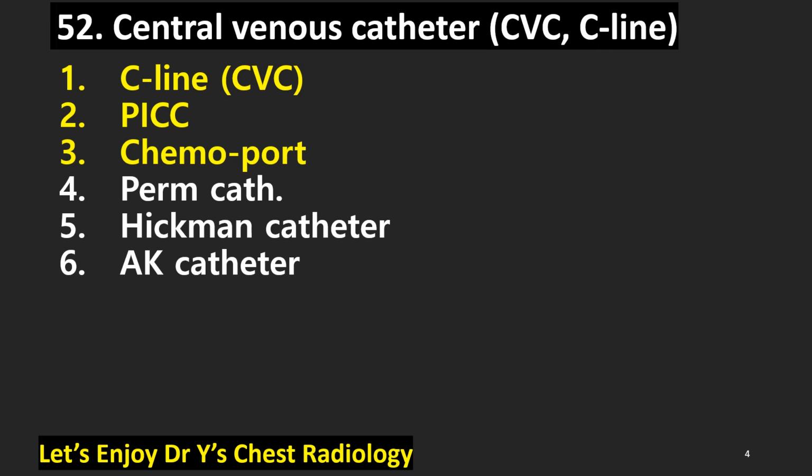Actually, all are central venous catheters. Among them, we have C-line, PICC, chemoport, perm cath, Hickman catheter, AK catheter.